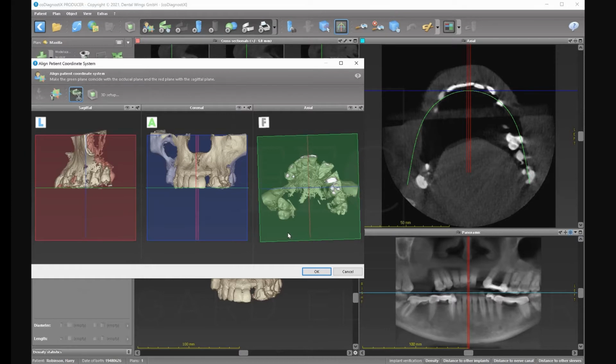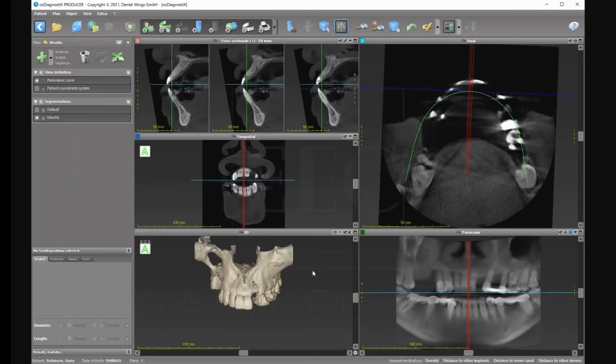And now I am centering the patient to look. But now what I did is it moved the whole jaw like that. Okay, it might be like this. The patient might be like that, so it's okay. For this it is not important, but when you're doing a full upper case, that's a very important thing. Okay, so now it corrected it, so the view for you is good.